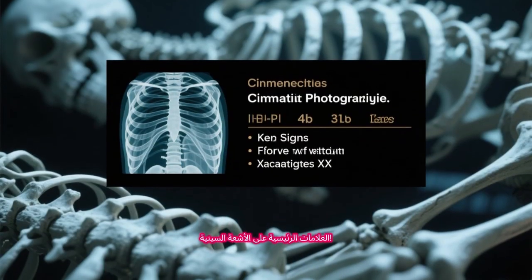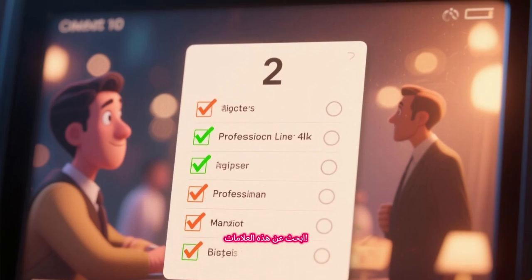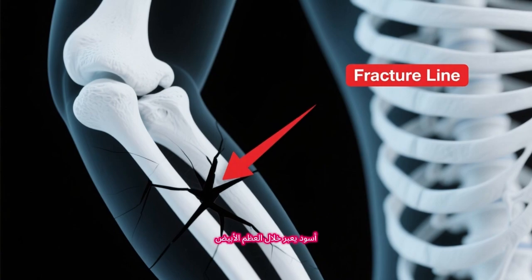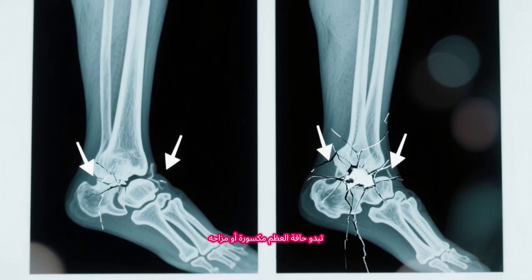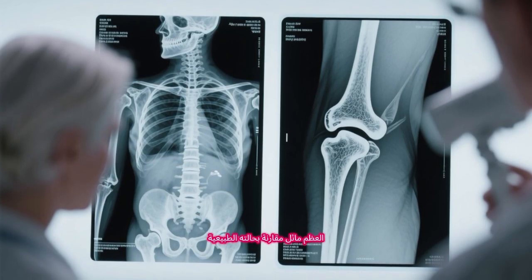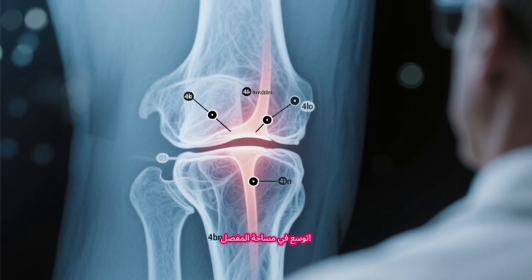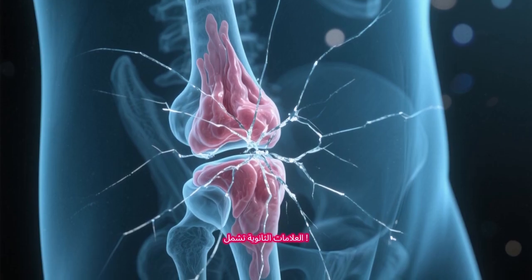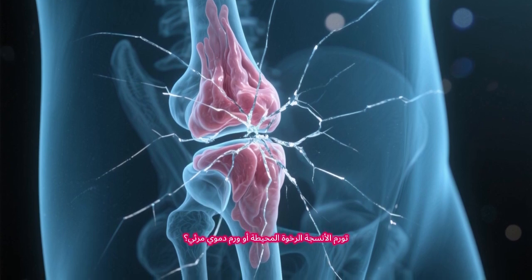Key signs on X-ray. When examining an X-ray, look for these signs. Fracture line: a dark, sharp line crossing the white bone. Step-off or cortical disruption: the bone edge looks broken or shifted. Abnormal angulation: the bone is tilted compared to its normal alignment. Widened joint space: if the fracture extends into the joint. The secondary signs include swelling of surrounding soft tissue or visible hematoma.